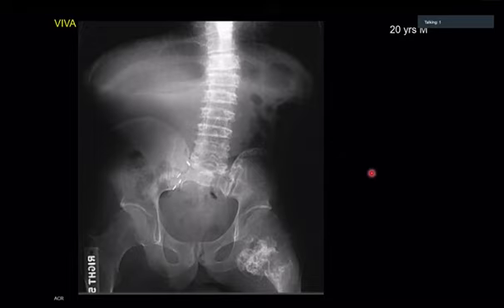So the clips are projected over the right hemipelvis. In that age group, it could be something like leukemia or lymphoma, but it doesn't really account for the surgical clips. Yeah, surgical clips, right or left, can be misleading because there might be lymph nodes there where they have removed it.